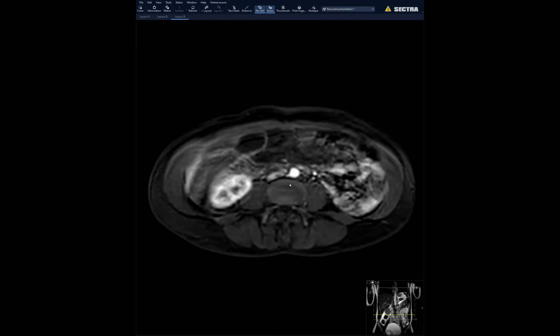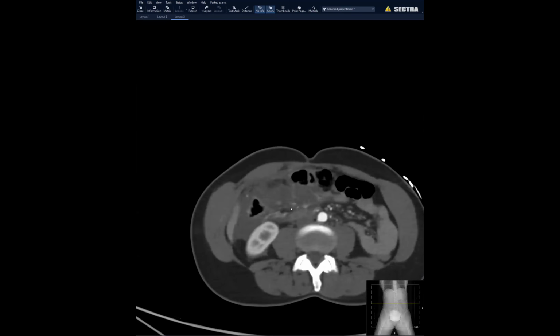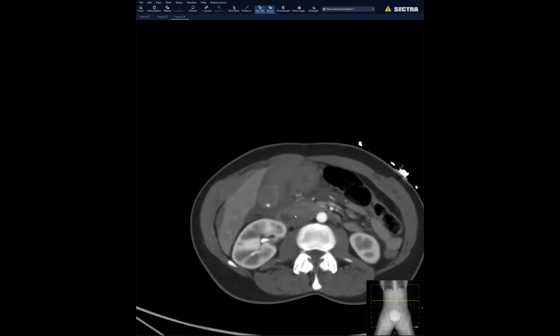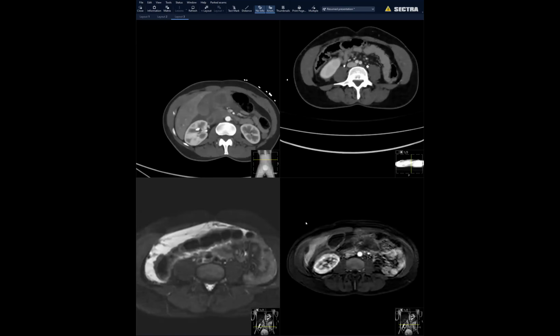But nevertheless, looking at the increasing fluid, we questioned the gallbladder irregularity and actually went back on the CT and found that area is still a little dusky. So we went ahead and called this a probable gallbladder perforation with bile and hemorrhage. And that's exactly what they found on surgery. They said the minute they opened the abdomen, there was a gush of bile from the fundus of the gallbladder. So this was one where even though we didn't do Eovist, because there was increasing fluid and that little bit of fundal irregularity, prospectively we called it and luckily got it right.